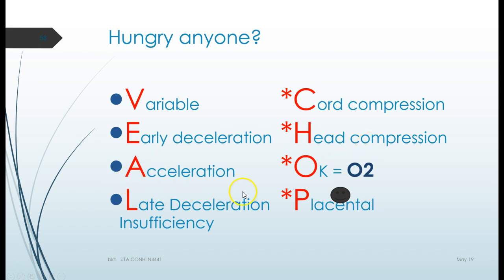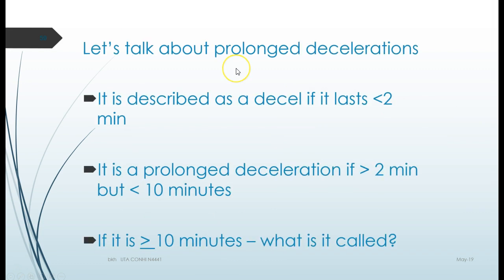An acceleration tells us our oxygen is okay. We're fine with accels, we like those. Our late deceleration is placental insufficiency. We need to do something about this. Just a reminder about our prolonged decels.